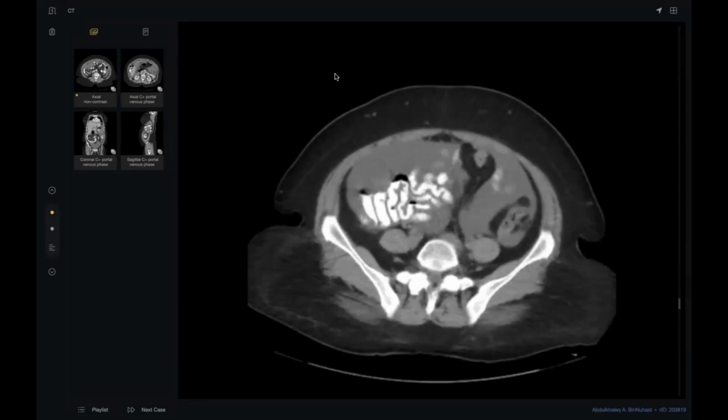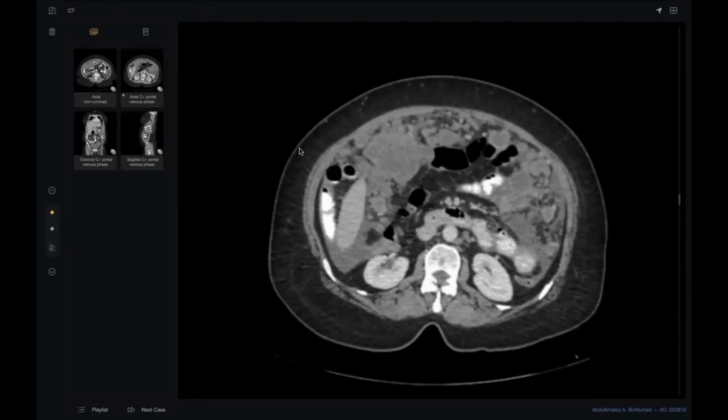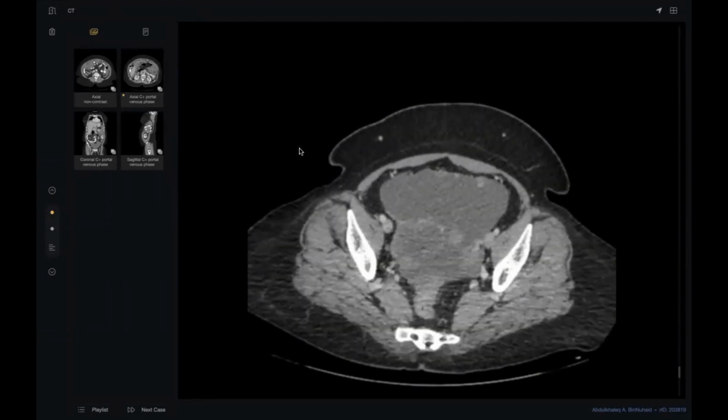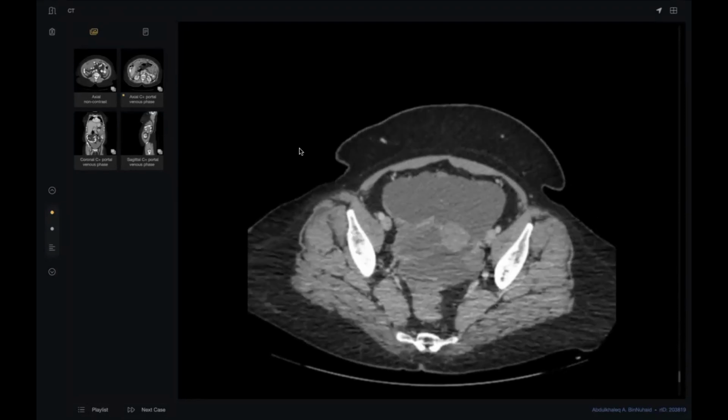Okay, take the post-contrast, please. On this post-contrast, there is mild enhancement of the previously mentioned multiple nodules and masses of the omentum, proving this is a mass lesion, most probably omental caking, maybe related to adenocarcinoma of the abdomen or pelvis. So I will review the pelvis for ovarian lesions. There are also nodules seen at the anterior peritoneum, at the lower peritoneal pouch.